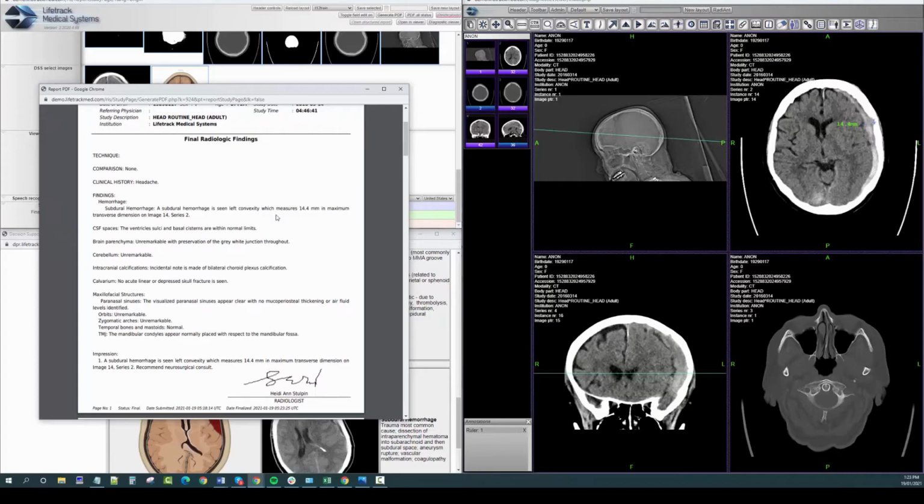So that's what a radiologist using LifeSys might look like. I can still report to work without spending 4 hours on the road. I have all the tools I need already on my computer. Logging in and viewing a patient's study is simple and fast. I can work on cases immediately as they come in, and I'm not stressed about backlogs. I can even prefetch images on my next cases, so the images are being downloaded while I work on my current case. And with how quickly I can write reports, I have more time to do other things like maybe go back to breakfast, just chill, or maybe squeeze a workout in.